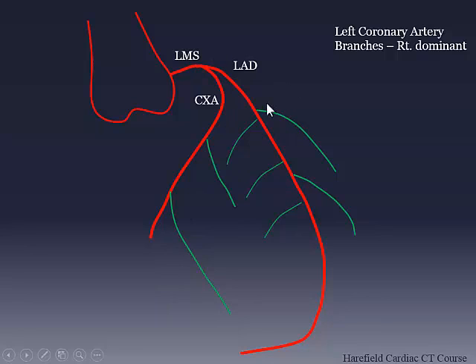Traditionally, we'll maybe see the first. We don't really see the second very well. And then you very rarely see septal branches unless you've got a very big LAD, and usually in young people. But it's not uncommon not to really see the septal branches very well. So when we report, we divide up the circumflex into 2 bits, proximal and distal. And it's divided up by the obtuse marginal. So usually OM1 splits it into the proximal and the distal.